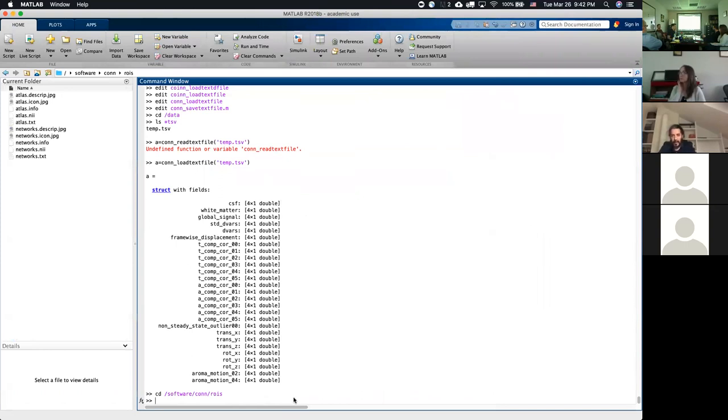You can enter annotation files as an actual atlas, and you can specify the LUT text file that specifies the association. That is all accepted by our scripts as well. That is one way, for example, to use different non-consecutive numbers for different ROIs.